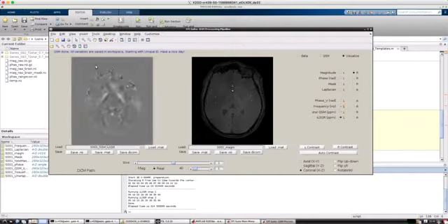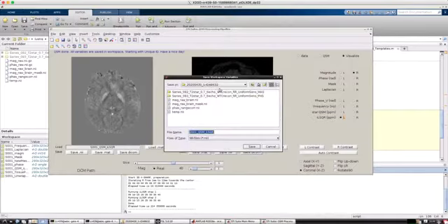and I can also upload the star QSM and the iLSQR QSM maps in ppm, and this is sort of what you want to save. You can save in DICOM or .mat, but usually I save it in NIfTI format, and I just save it in my current folder.